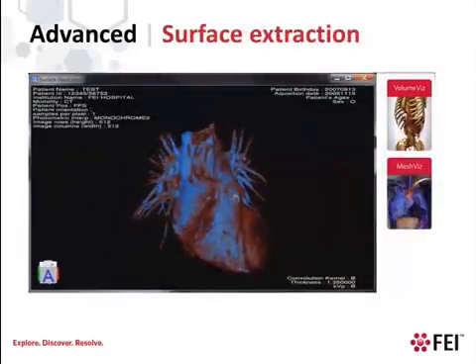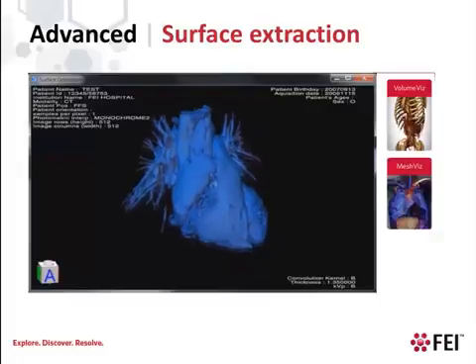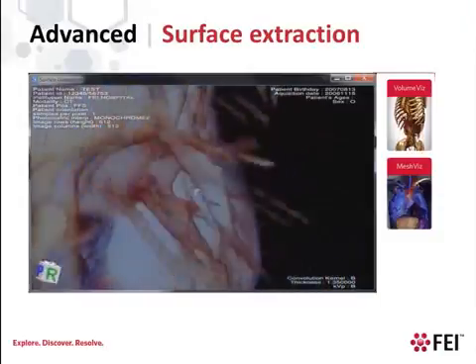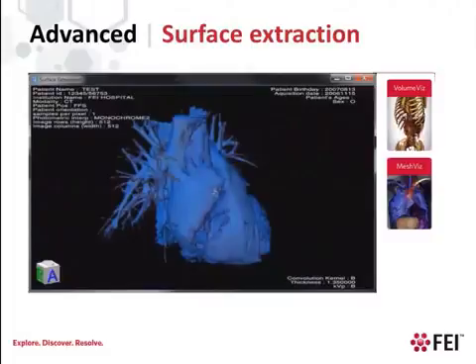Using a GPU-based technique, Volume Viz can rapidly display one or more surfaces corresponding to ISO values in the dataset. This technique is quite interactive, so we can use it to interactively explore a dataset, or, in this case, to visually select the optimal ISO value. Then we can use the Mesh Viz extension to extract the actual geometry of the ISO surface as a triangle mesh.